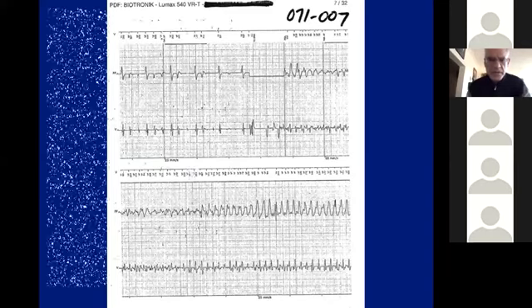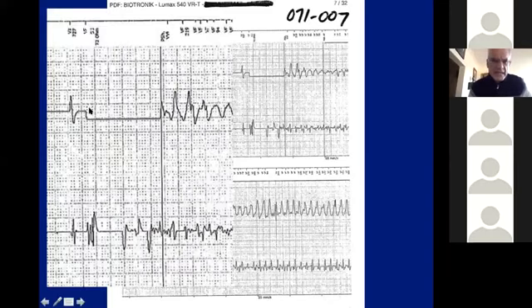Let me enlarge it for you. This is the event that actually triggered that. You can see that the device declared ventricular fibrillation there. Even though I don't know what happened, this was sent to me from somewhere, and I see the 73 ohms, so it must have delivered a shock.